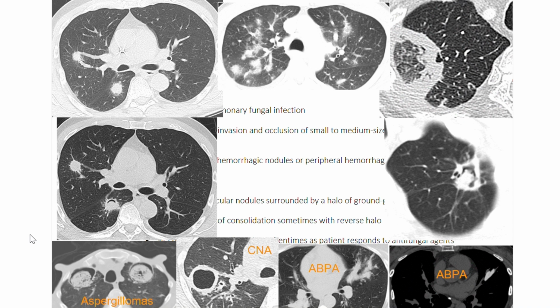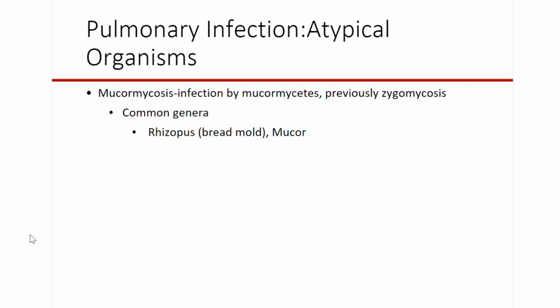Aspergillus makes manganese. So this is actually manganese, right? We know that fungal sinusitis is bright. I'm showing you that fungal bronchitis and bronchiectasis can be bright as well. So this is from manganese. So when Dr. Tesorius talks about fungal sinusitis, you can say, that's manganese, Dr. Tesorius.